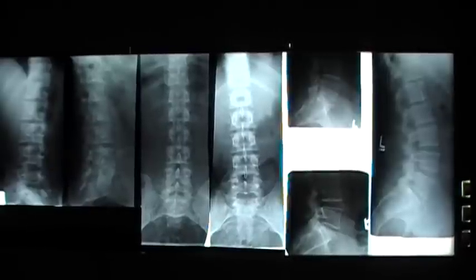This is the lumbar spine series. To the left we have our obliques, the right and the left oblique. These were AP obliques. You want to be able to count all 5 lumbar vertebrae. You want to be able to see your Scotty dogs on these.